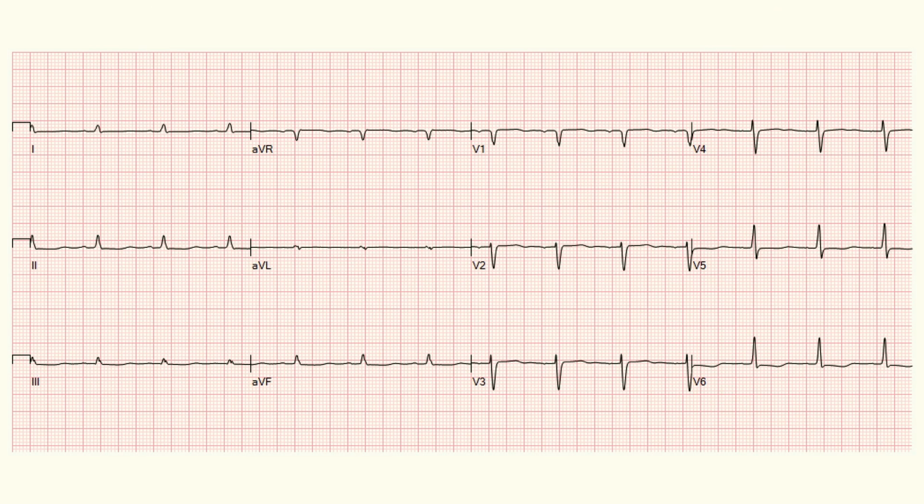All right. Now, I told you that the gain is kind of like the volume knob of the ECG. And remember that you're measuring myocardial depolarization. So if you have a lot of left ventricular mass, the volume's way up. There's more myocytes shouting at you about what's happening in the world of depolarization. So you can just crank that volume knob back down. You see the height on that little thing on the left side got a lot shorter. This is 2.5 millimeters per millivolt. So this is quarter volume. And it starts to look more normal, by the way. You don't see as much ugly stuff because I've turned the volume down to accommodate for the enormous left ventricular mass.